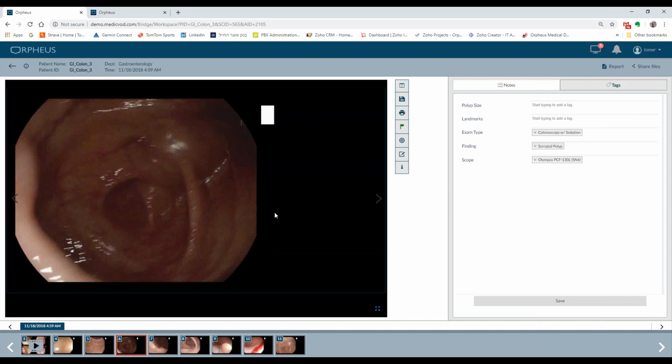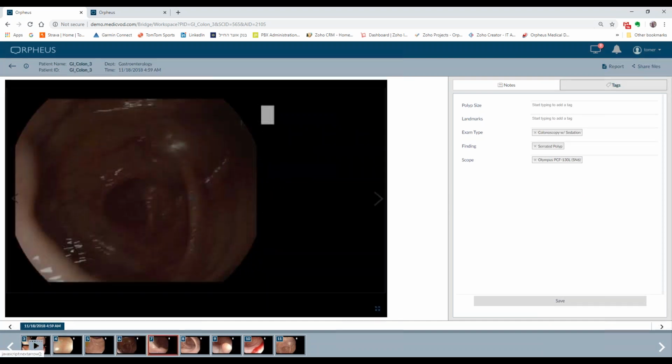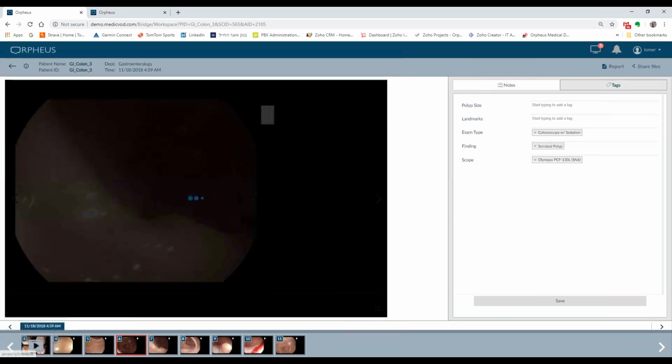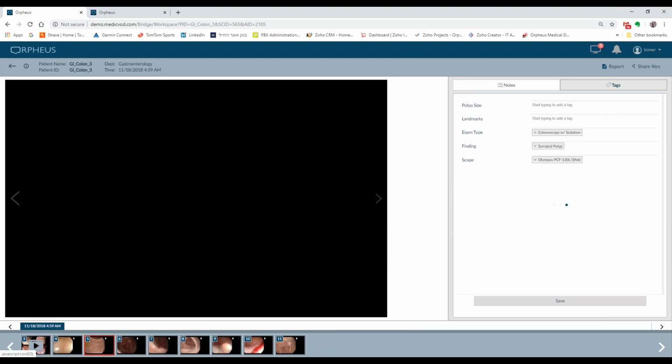All right. The things that you can do with the media, of course, you can scroll through either by clicking the next icon, or if you have a more advanced version, you can see here little arrows that enable you to go forward and back.